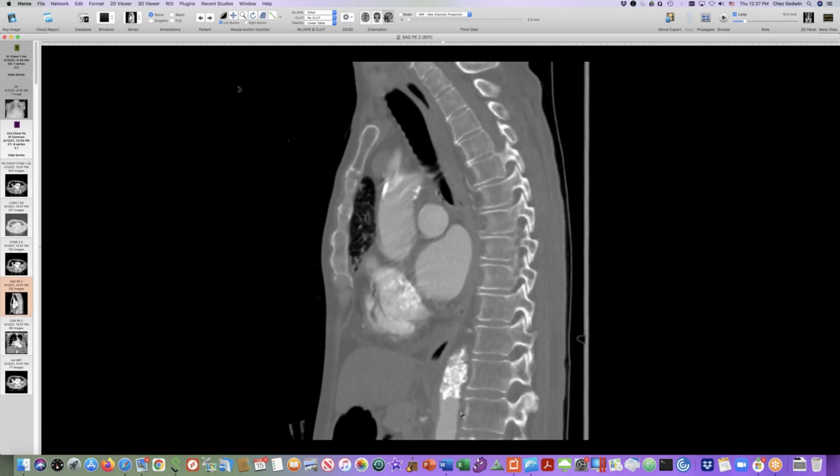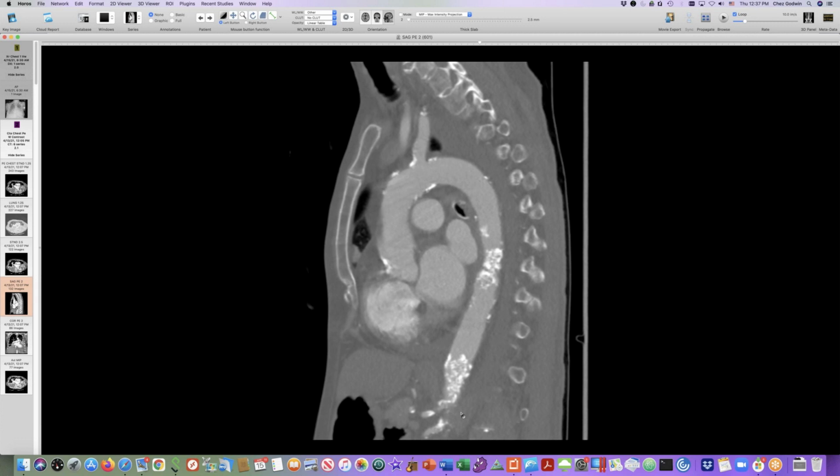Even if it fell apart, it doesn't look regular enough, does it? Right. You don't see a nice basket weave, right? So, any ideas? I was hoping that Seth and Mr. Aorta would be on today to help with this case.